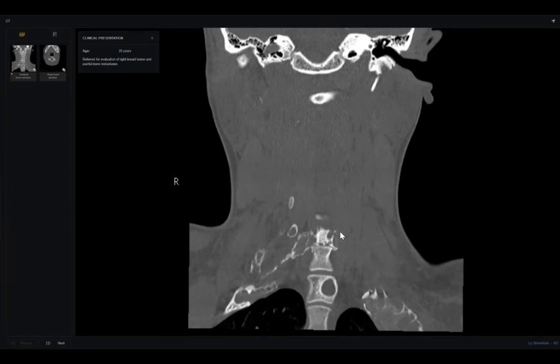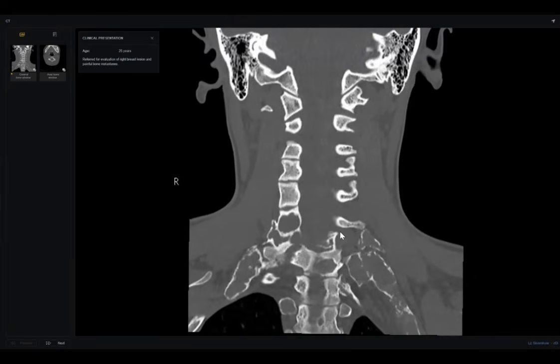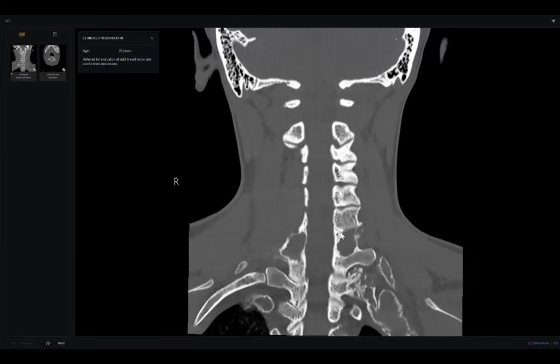Here, I will look for soft tissue calcification. So I think it is Maffucci syndrome. Okay, what else?